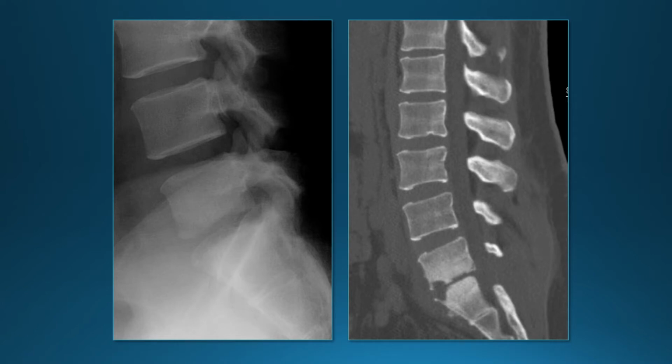Sometimes we have plain films. You can see plain film findings with spondylodiscitis. Note the normal end plate here, a little bit higher density than the marrow signal at L5S1. Same thing, the end plate is indistinct here, so you don't see that nice distinct end plate. There's some sclerosis in the adjacent vertebra. Hard to see. There's probably an erosion here.